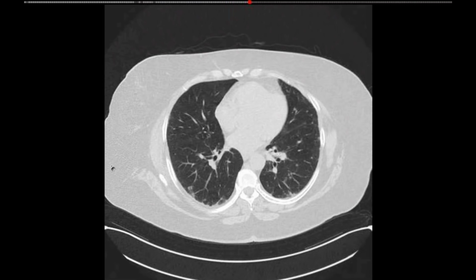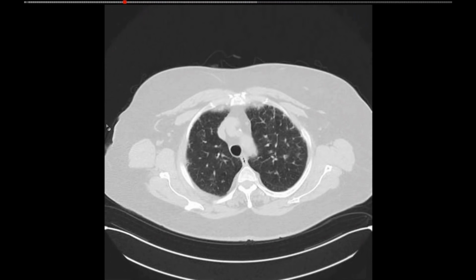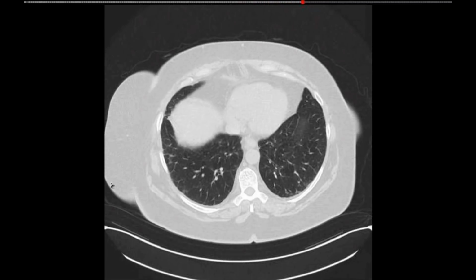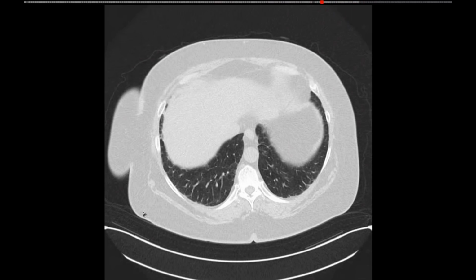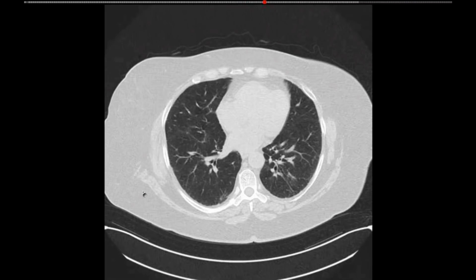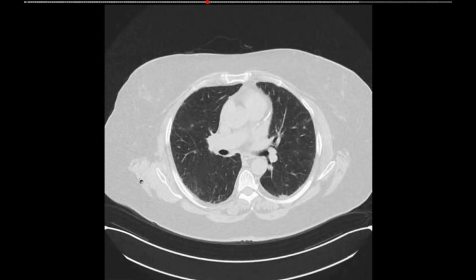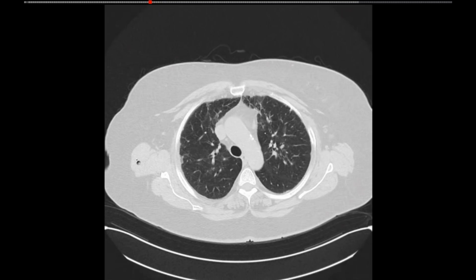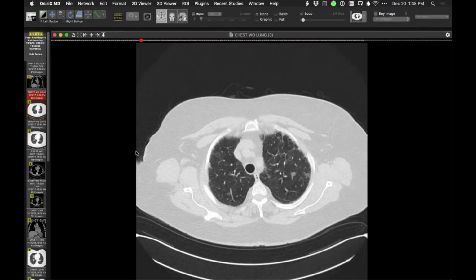So we have bilateral parenchymal reticulation. It is relatively sparse in the peripheral lungs. As we go down, we see that it's about the same in the lower lung zones as the upper lung zones. So this isn't a basal predominant disease distribution. We do not see in the peripheral lungs foci of subpleural traction bronchiectasis or honeycombing. And there are a few regions, let me see if I can pick them out, where one can infer that there is some fibrosis about bronchovascular bundles away from the pleural surface.